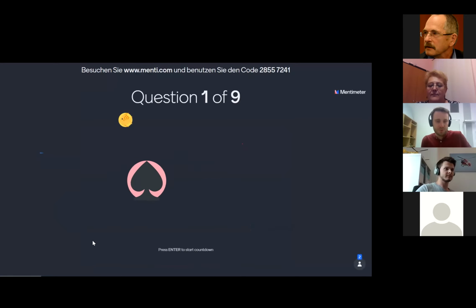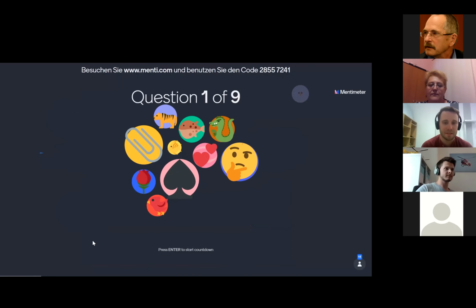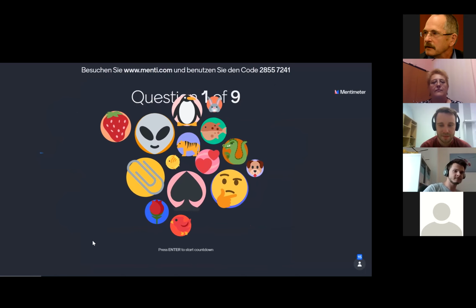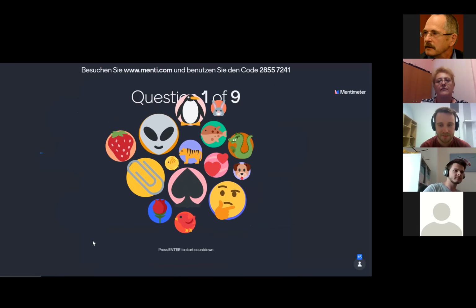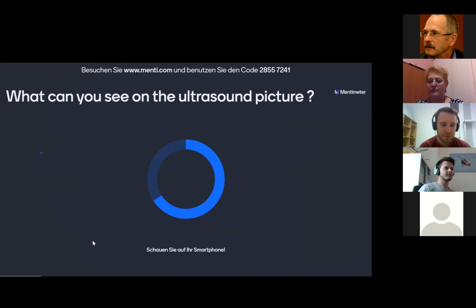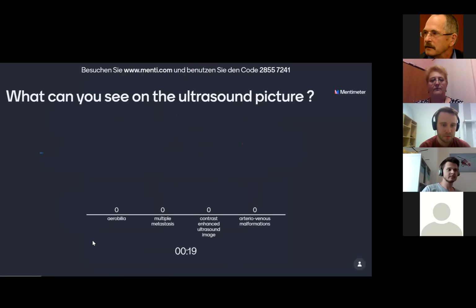Now you have to choose. You get more points if you answer fast. What do you see in the picture?